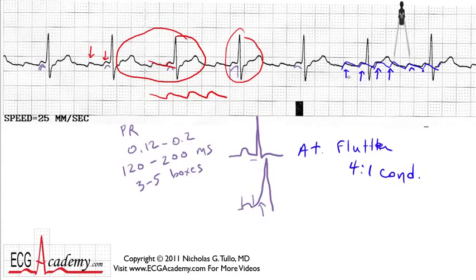Well, in a normal person, perhaps in the middle of the night while they're sleeping, you could easily have atrial flutter conducting here at 68 beats per minute. Think of 68 as about 70. 70 times 4 is 280, and that's kind of where we thought our atrial rate was, about 275 beats per minute. So if the atrial rate's 275, 1/4 of that runs out to be about 68 beats per minute, which was kind of where we thought the ventricular rate was. So it all adds up. You've got atrial flutter with 4-to-1 conduction.